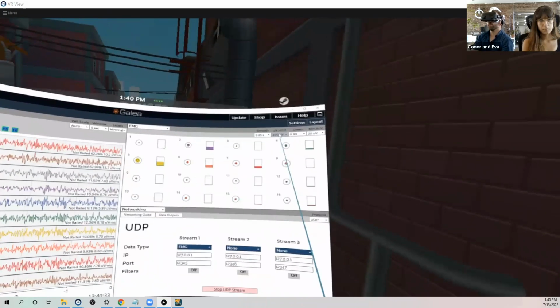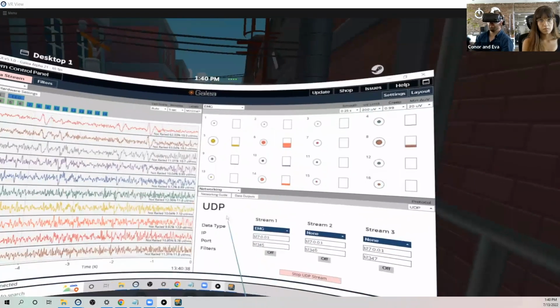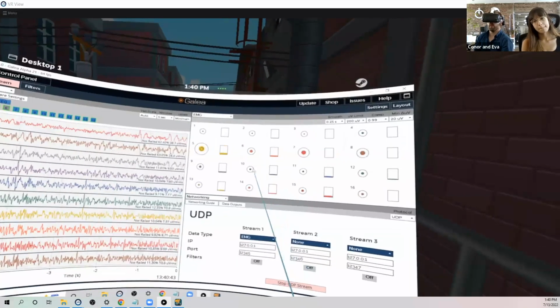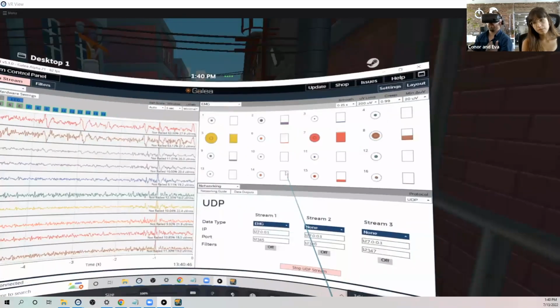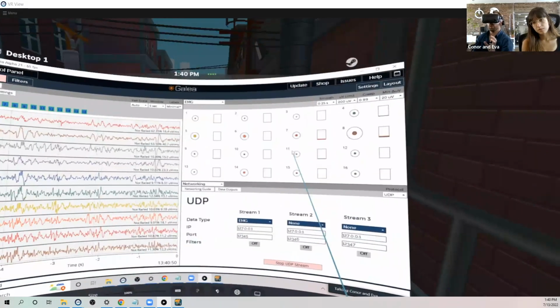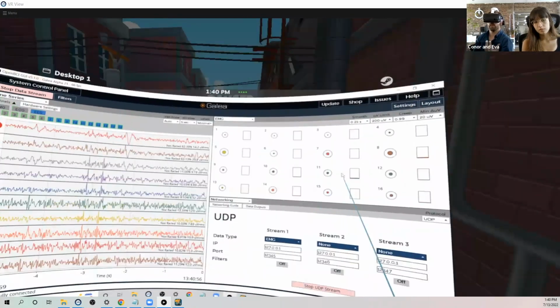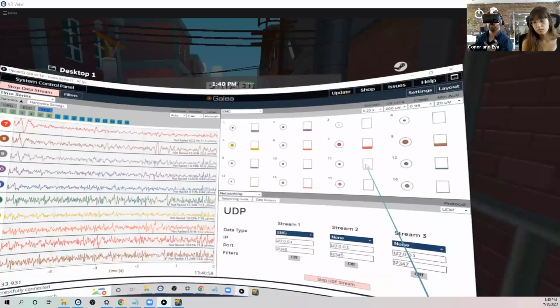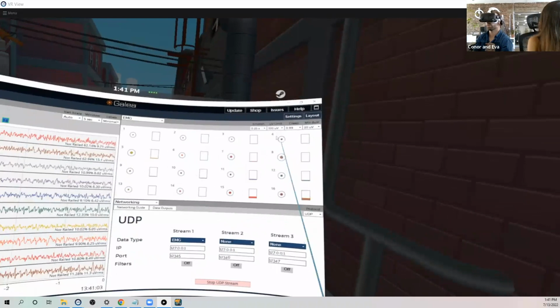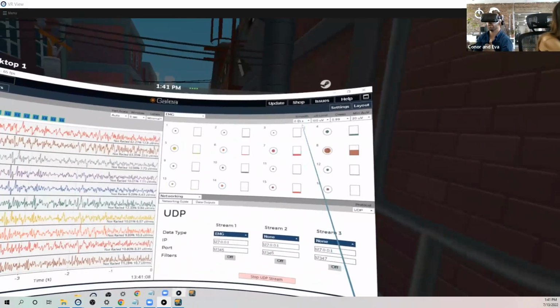The UV limit is actually a microvolt limit. If data comes in above that limit, it gets ignored. This is really set so that if dropped packets happen, or if you have movement artifacts of the system moving or jumping across the skin, you can essentially set a threshold for ignoring data that's outside of the expected window of the microvolt range. So if I drop this down to 100 microvolts, anything above 100 microvolts in value will be excluded from the data set that gets averaged here.